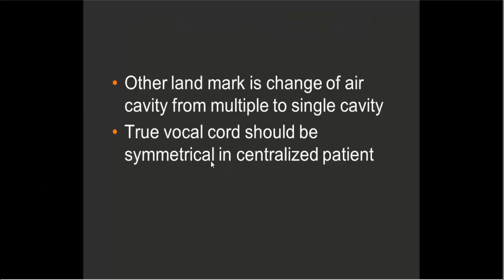Another landmark is the change of the airway cavity from multiple cavities to a single cavity.